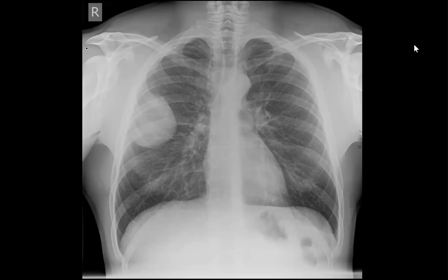There is no evidence of any calcification or fat density within the lesion. I'm not seeing any erosion of the adjacent rib cage. However, in my routine practice, I may zoom this area to detect any underlying rib erosions. The right rib I'm not able to trace fully.